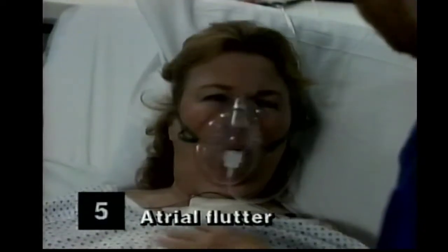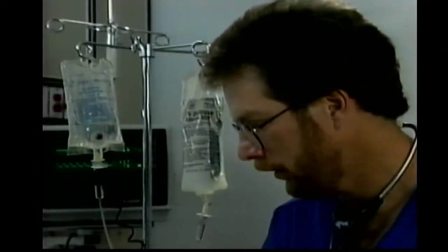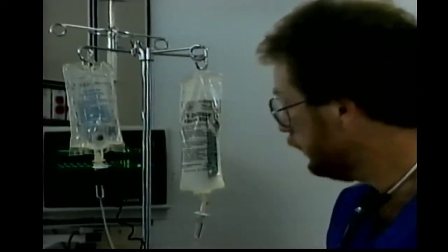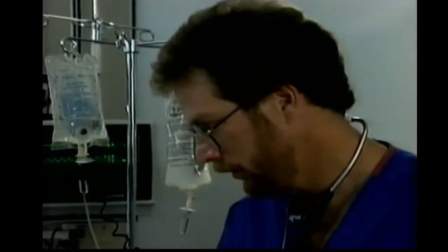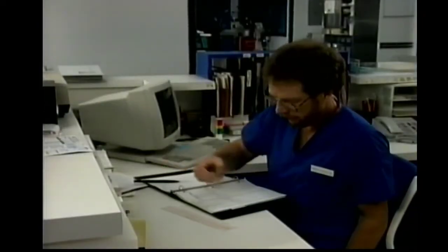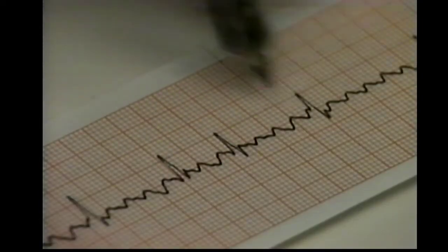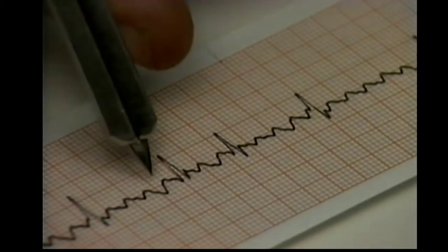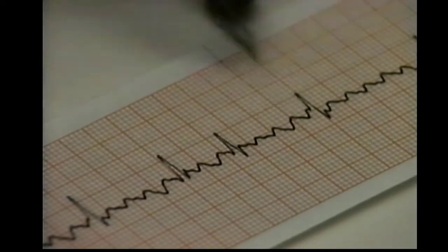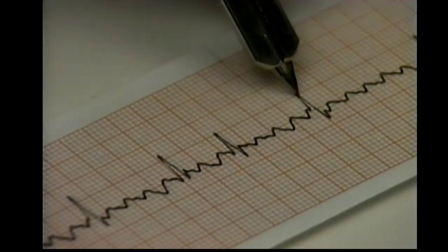This patient, described at the beginning of the program, developed a dysrhythmia 1 day after triple coronary artery bypass graft surgery. The distinctive sawtooth waveform pattern of atrial flutter was seen on the monitor. Analysis of a rhythm strip confirmed the dysrhythmia. Normal P waves are not present. Instead, sawtooth-shaped F waves, or flutter waves, are noted. The ratio of F waves to QRS complexes is variable, from 2:1 to 6:1.